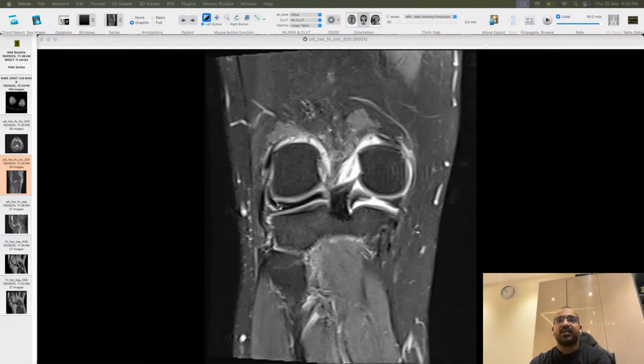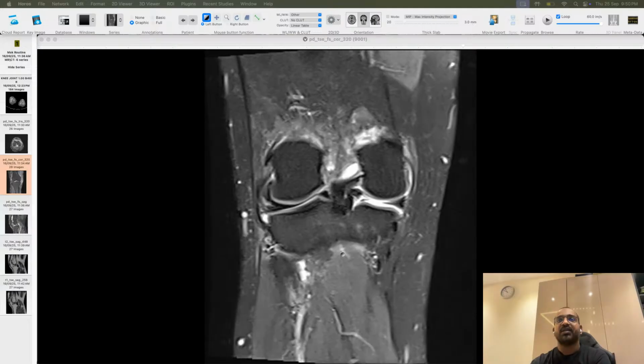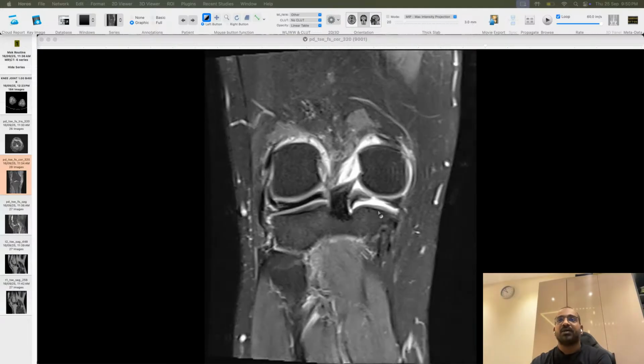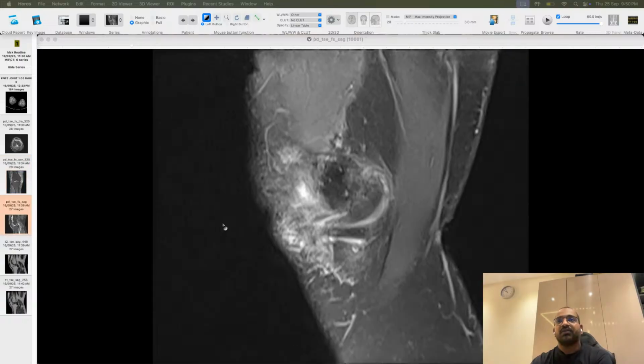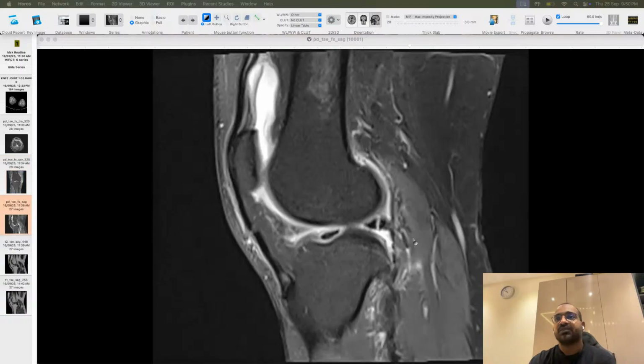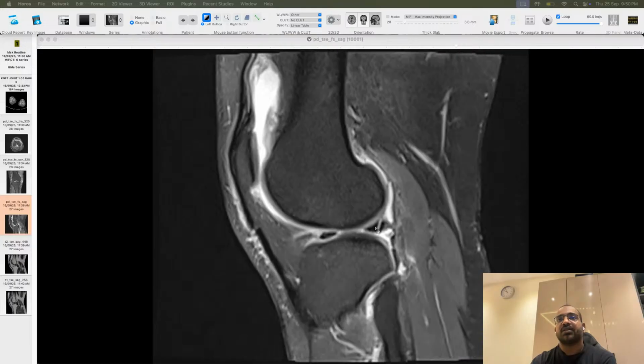This is our popliteus tendon, popliteus muscle. Okay. So that is there. Then medial collateral ligament we have mentioned. Then we have seen the bucket handle tear, full thickness tear of anterior cruciate ligament. Then if we go to the lateral meniscus, what is happening to the lateral meniscus? If you see, there is meniscocapsular separation.